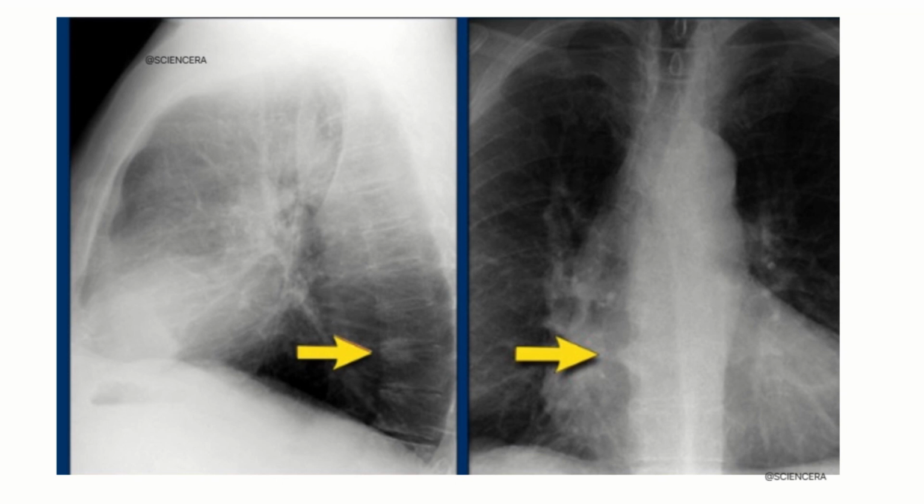When looking for spondylosis, we have to pay attention to the right side because spondylosis is often found there. On the left side, it is less common because of the pulsation of the aorta, the big artery in the chest that can make it harder for the bony growths to form. Bony growths are your osteophytes. So, there is a less likely occurrence of spondylosis found on the left side.